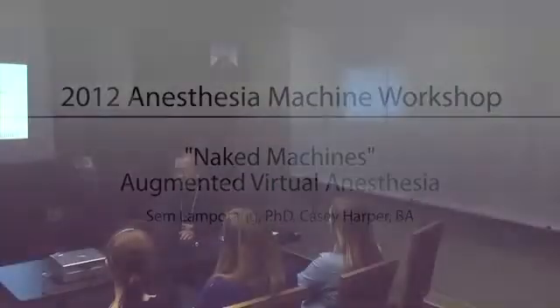So we're going to start with a case. Dr. Hu asked us to present it as a case. General endotracheal anesthesia, uneventful pre-oxygenation, intubation, induction. We're going to do this to begin with a bellows ventilator.